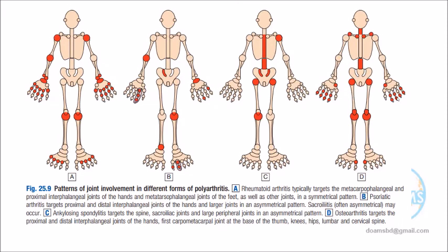From the D, symmetrical. How symmetrical? It seems to be symmetrical, but exactly not symmetrical. If you look at these joints of the hand, the ring finger is the same, and in the small finger two joints are involved. Here only one joint. Dr. Abdullah, it seems to be symmetrical, but not symmetrical.